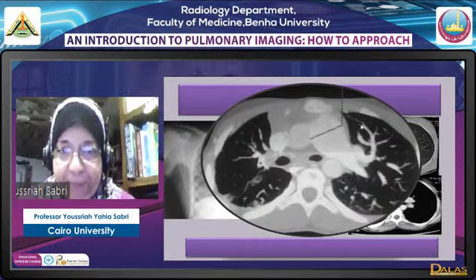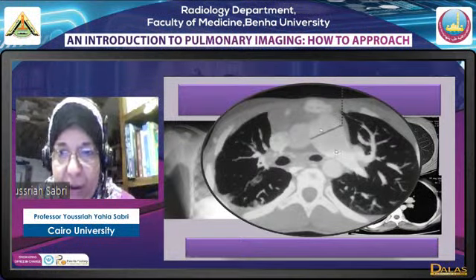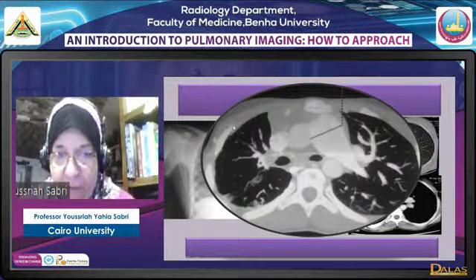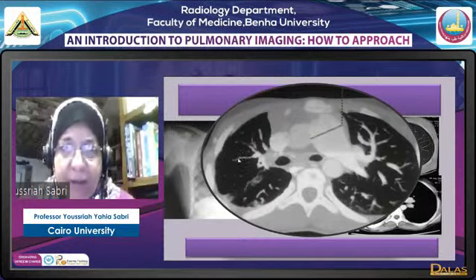We find here the main pulmonary artery, and this is the left. They are enlarged. There is no right pulmonary artery. The bronchial arteries are prominent. There is pulmonary circulation in the lung, but it is not coming from the pulmonary artery. It is coming from abnormal ways.